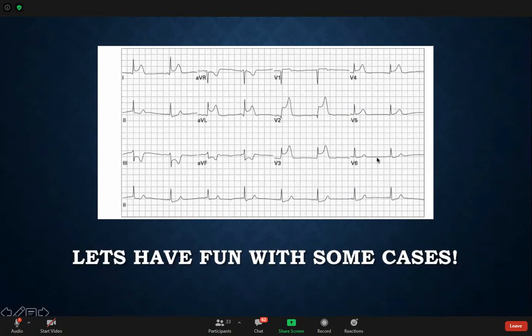So there's these deflections. It's not that very clear, and that's why ECG is hard. It's not always easy. It doesn't come textbook. You have a positive deflection at lead 2, right, with the normal morphology. So we'll call this sinus.